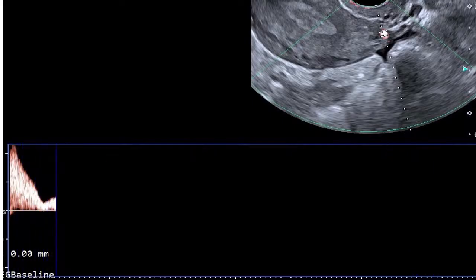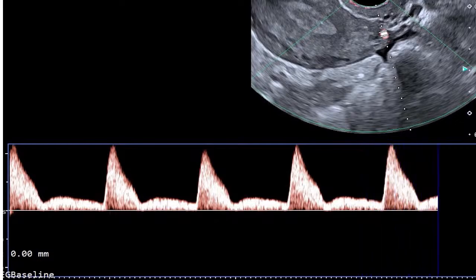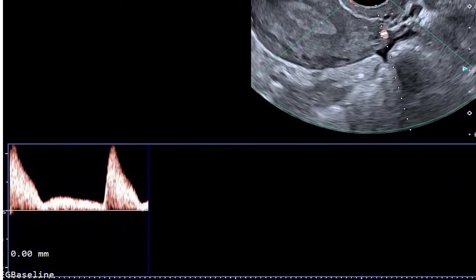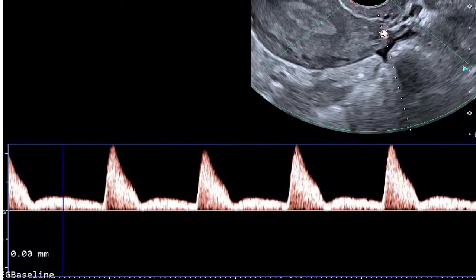By analyzing resistance patterns and notch presence, we determine if the uterine environment is hemodynamically prepared for implantation, bridging the gap between the raw spectral Doppler signals and successful clinical reproductive outcomes.